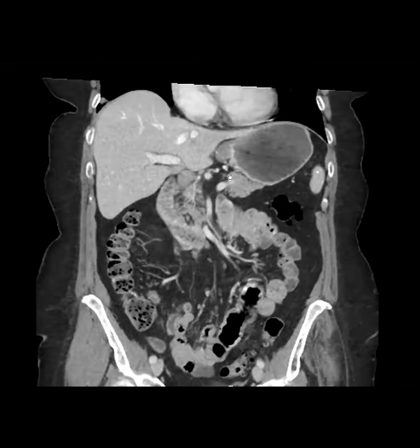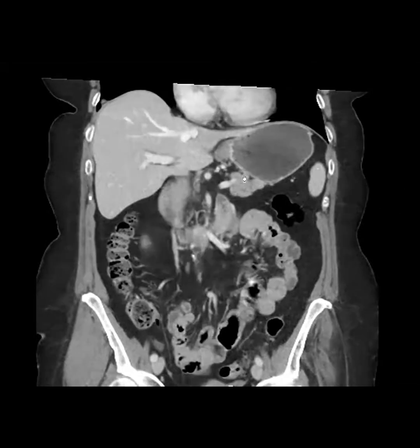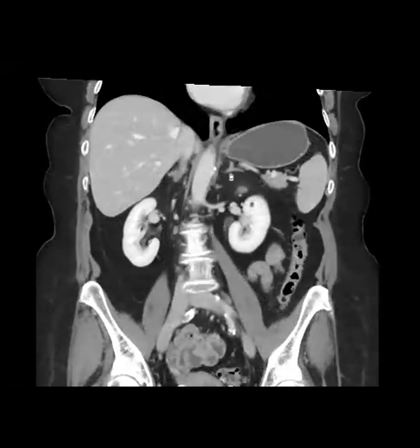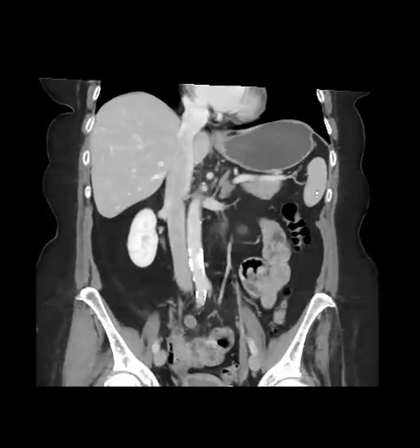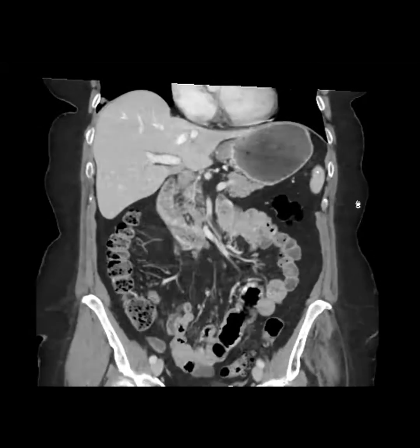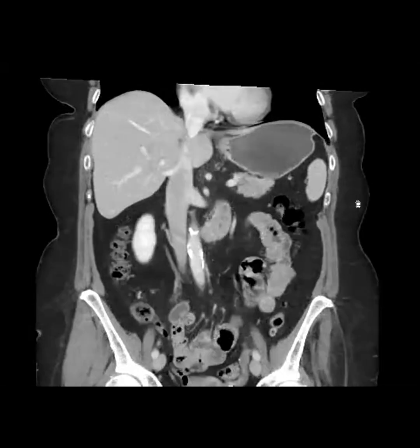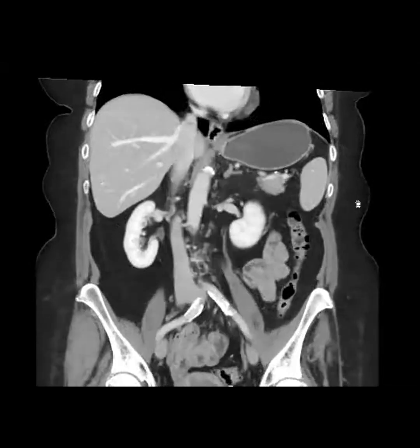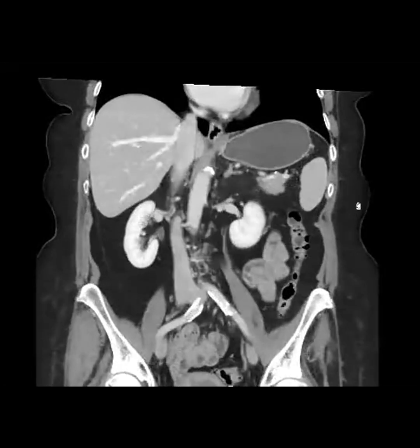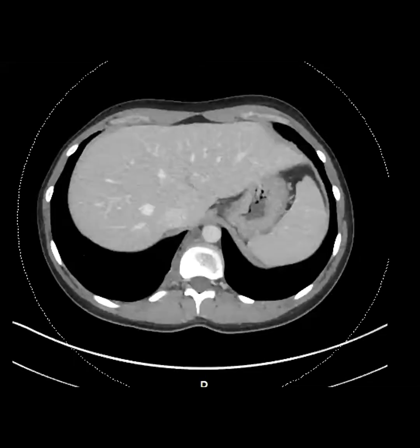But that's good for the patient because one important thing in this case is, do you see how close it is to the GE junction? Our surgeons always want to know that. It's not super close, but that's one of the reasons they want the gastric protocol. If it's touching or involving the GE junction, that's a much more complicated surgery. Any gastric tumor involving the GE junction often requires a total gastrectomy. True. Cool. Good for the patient.